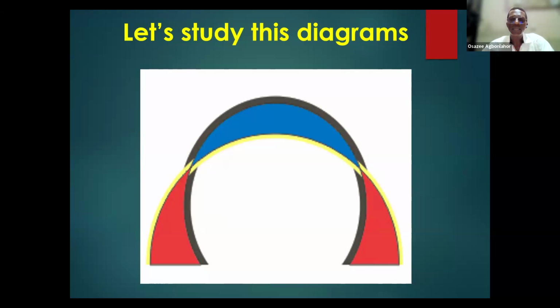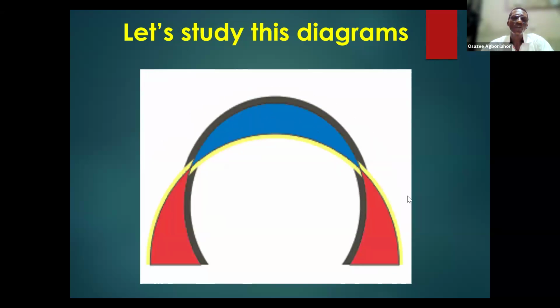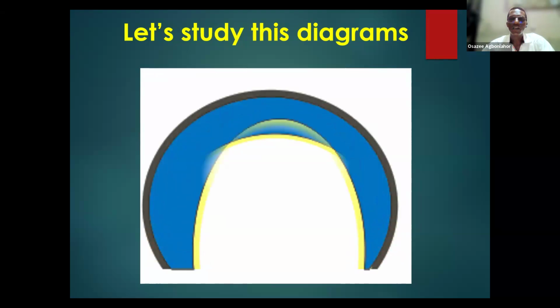Here you find that some areas are much more elevated compared to other areas. The red areas are elevated while the blue areas are depressed. Now you can see that it's not a matter of whether it's curved or more curved. A steeper area can be depressed. It's possible, okay? As elevation and curvature are not speaking exactly the same thing.